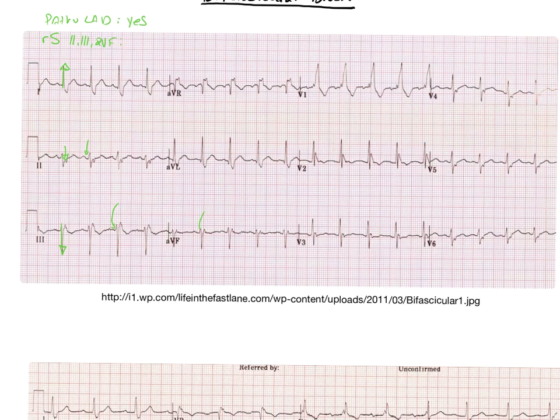But in 2, it doesn't look quite, would that still be considered? Because it looks pretty even on both sides. Well, where's the S wave? Going up, down. No, the S wave is right here, right? No, in 2. Oh, I'm sorry, in 2.